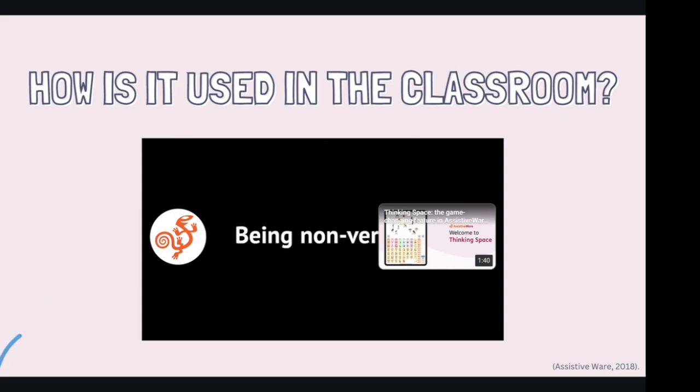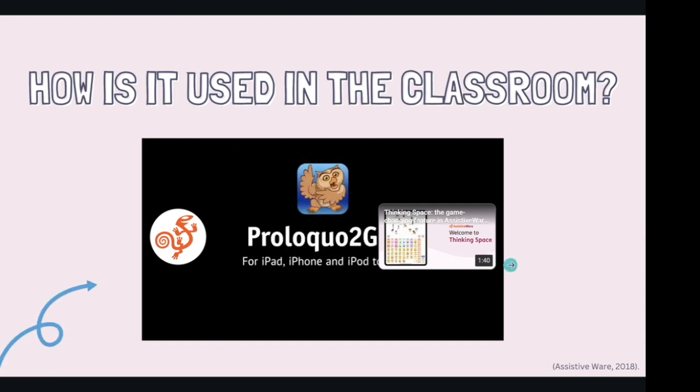Being nonverbal doesn't mean we can't speak. We want to show you who we are. Anywhere. And anytime.